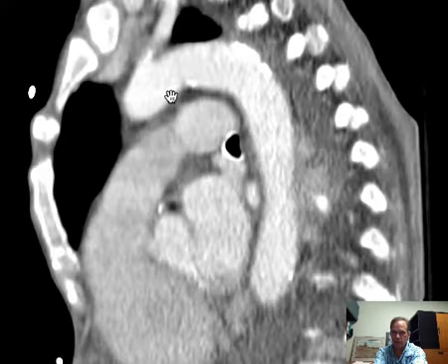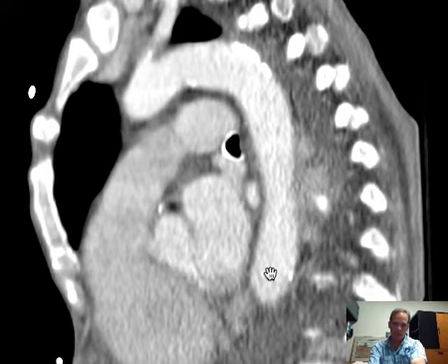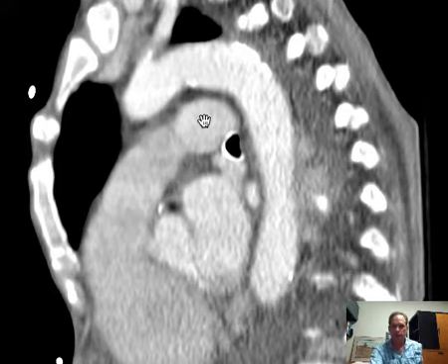Well, we can very clearly say that this is the aortic arch. So now you can see the aortic arch and the descending thoracic aorta, and you see what happens is the main pulmonary artery comes out very anteriorly from the right ventricle and then dives back. It dives back and divides beneath, inferior to the aortic arch.